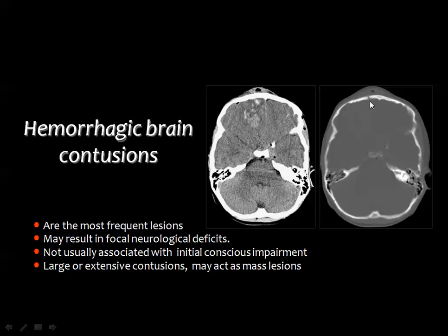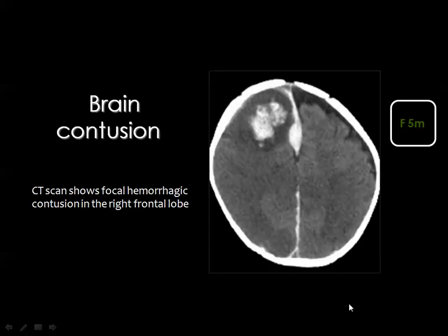But you know that there are contusions which are known as countercoup injury. There is a frontal trauma and you get the injury in the occipital lobe. And this is well known in clinical practice. Then, in cases of trauma, if you see a cortical lesion, which is a mixture of hyperdensity fresh blood and hypodensity brain edema, this is hemorrhagic brain contusion.